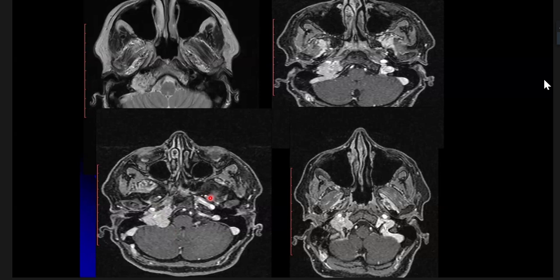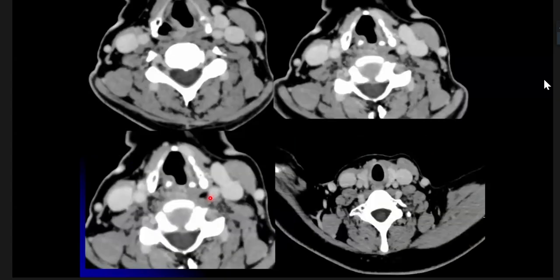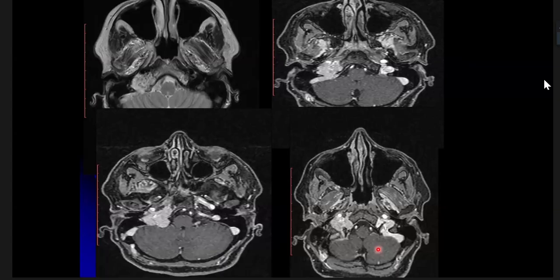So your DD is the lesion is explaining all the features of this vocal cord palsy, sternocleidomastoid atrophy. In fact, patient has a tongue atrophy as well. Paraganglioma. Excellent. What is the DD for this? So much intensely enhancing heterogeneous jugular foramina.